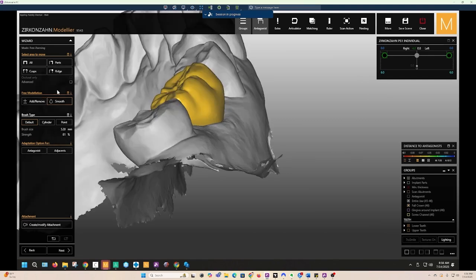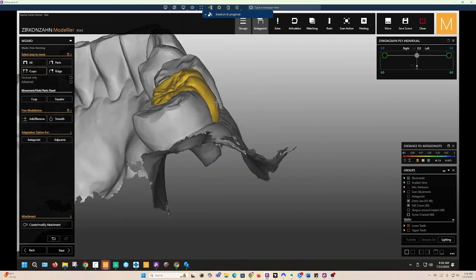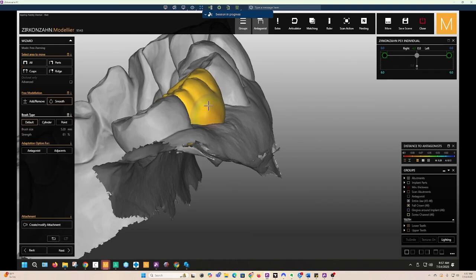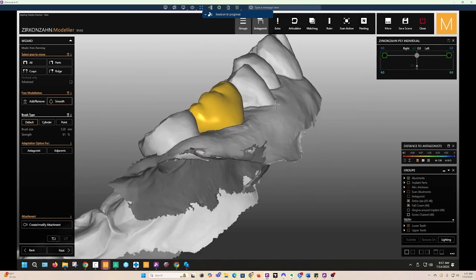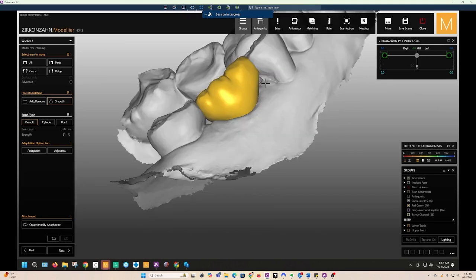See this part here, let me check. I think cusps is what I tend to use. Good, that's looking nice. And then alternatively, I smooth it. So I smooth it here, and then there. See how that's quite dramatic? I'll fix that in a bit.